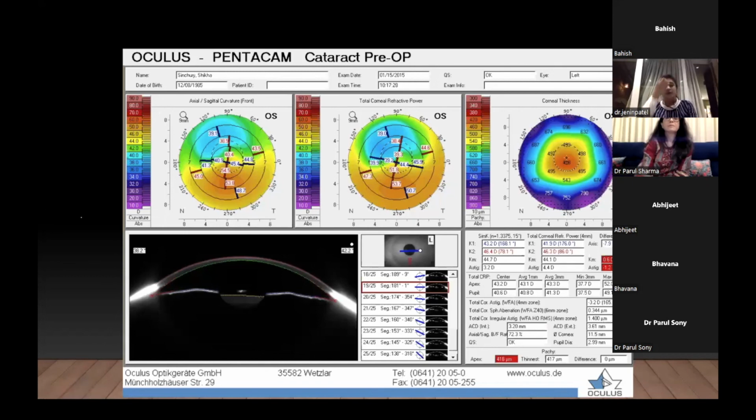You should pre-operatively counsel this patient for a residual refractive error and the possibility of not having optimum vision output.